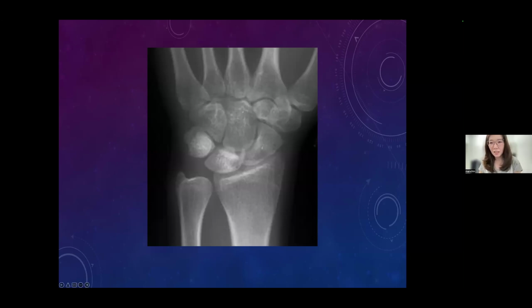Okay, everyone else, I will show you the anatomy. You just type me what is the bone name. Okay, what is this bone? Anyone? No, lateral X-ray. Don't talk about lateral X-ray first. You ask for lateral is good, but there's no lateral X-ray in this case. Okay, what is this bone? Sorry, this one. What is this bone, Betty? It's easy. Radius. Yes, good. So the other one must be ulna. Yes, so this is ulna.